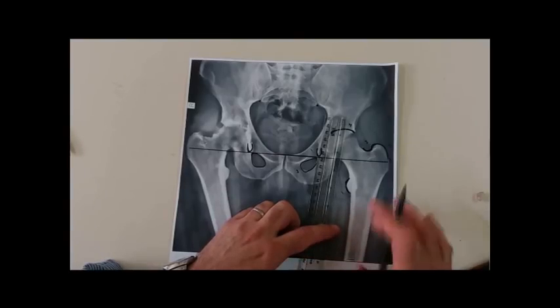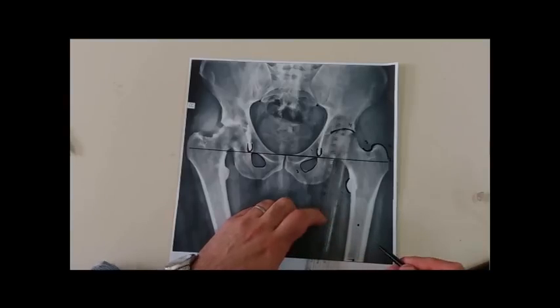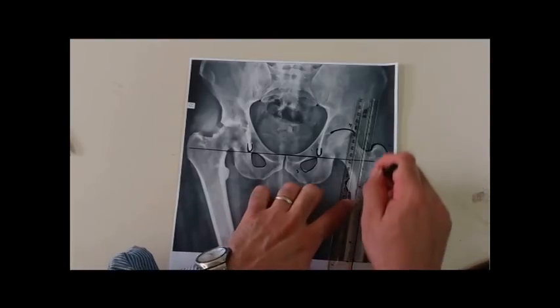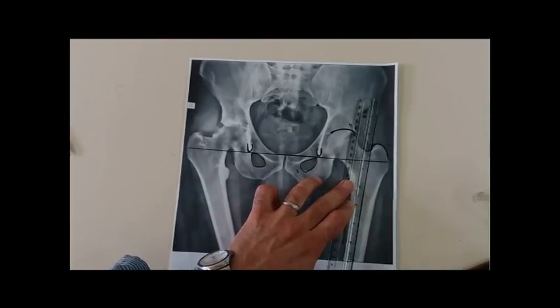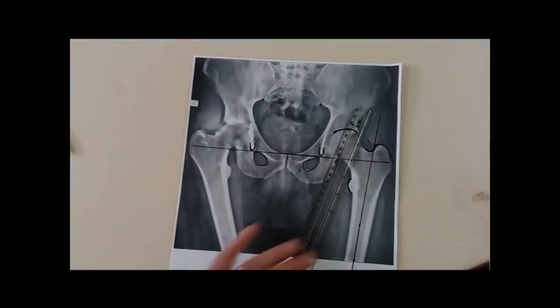How can we draw the intramedullary line? We use the diaphysis, taking a midpoint far away from the lesser trochanter and another point in the middle of the medullary canal, and we draw a line. This line is the intramedullary line. It is very important because the offset will be measured from it, and the overall alignment of the stem would be guided by this line.